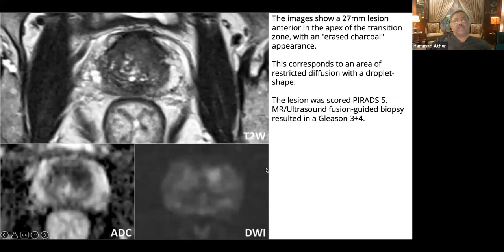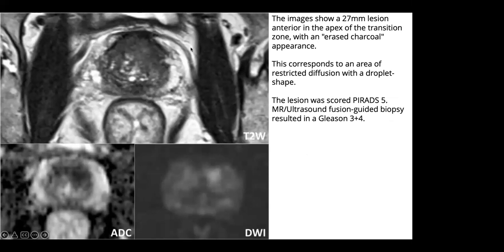So this is another big tumor. Dr. Basit, please. Again, if we look at the anterior part of the prostate, we see again a hypointense, ill-defined area, which is T2 hypointense, and on ADC mapping again appearing markedly hypointense with diffusion restriction.